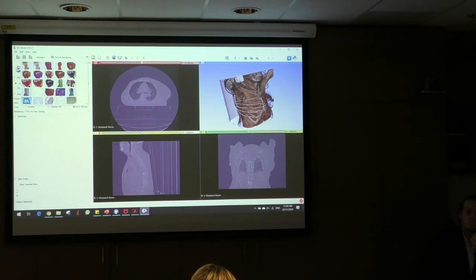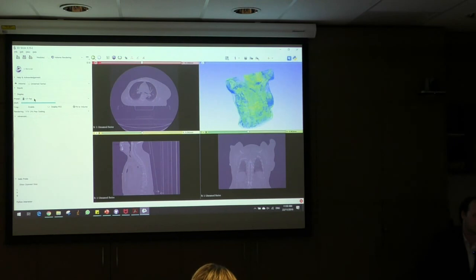Is that all just from the CT? Yeah, this is all just from the CT, yep. So raw CT data. And from here, we can also select other different various components, for instance, the CT of your fat cells. And we can, again, look at the type of different densities that are involved with those values there. So that's using those CT numbers that we were talking about earlier, which is inbuilt into the Slicer software itself. So, yeah, very interesting stuff.